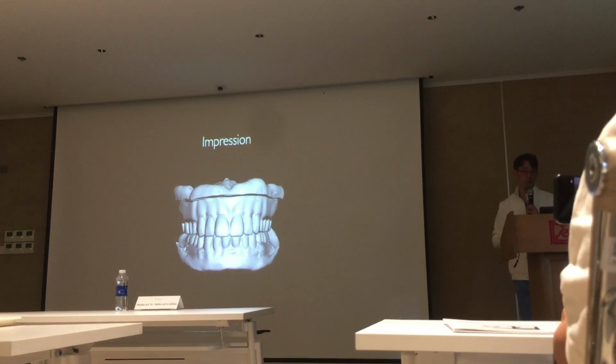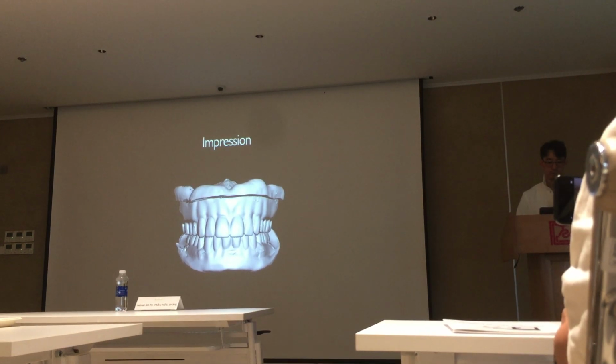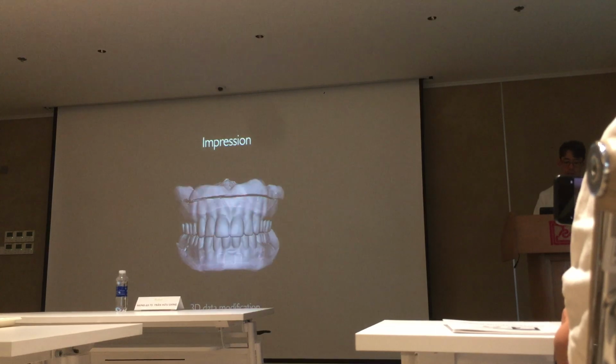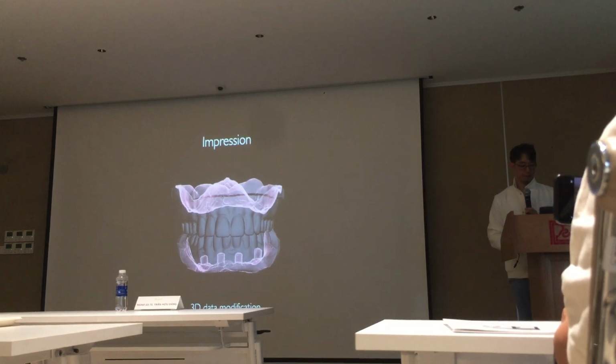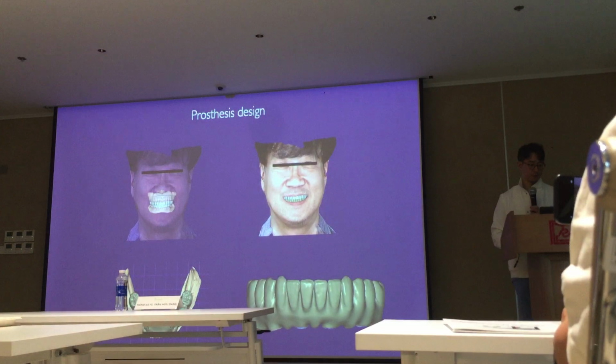In this data, we do have the information about the tissue surfaces, the outer surfaces of the denture, and the interocclusal record. And we can easily convert this 3D data into working CAD so that we can actually design the final prosthesis. With the help of the facial scanner, we could design our zirconia more aesthetically, functionally, and predictably.